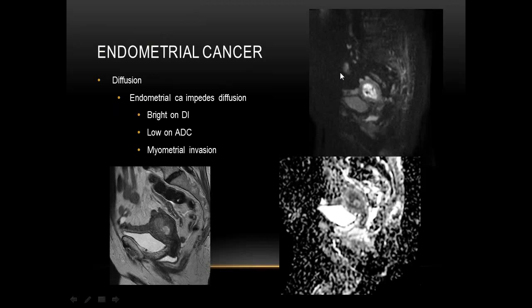This is endometrial cancer demonstrating restricted diffusion. Again, bright on our diffusion and low on our subtraction ADC. And diffusion has been described as helpful to evaluate for myometrial invasion.